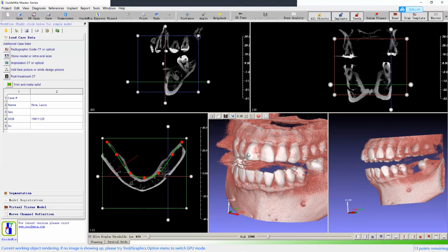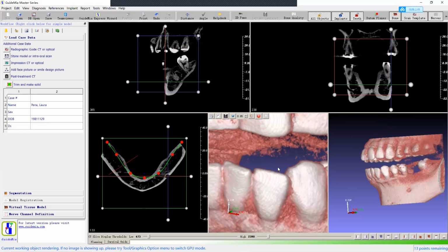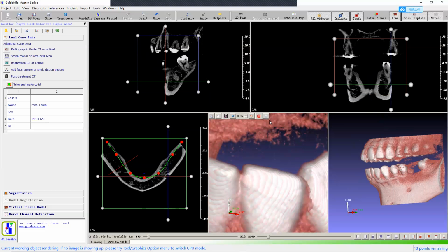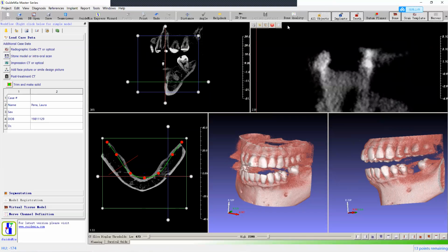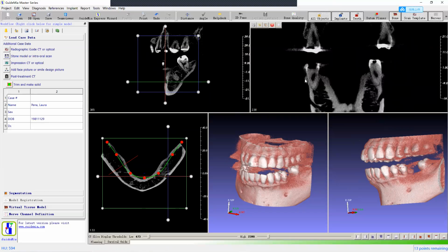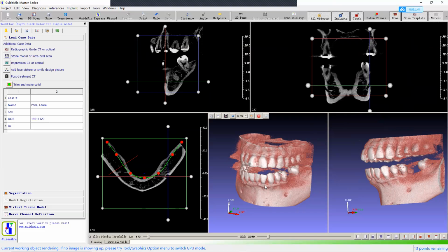Then on each of the toolbars, the last button is to zoom in and out. When you zoom it out all the way, or in all the way, and then you do this, it will take everything into the view. So when it's too big, you do that and it will come back.